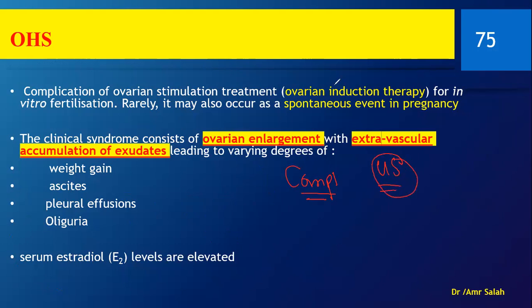that will make us suggest this ovarian hyperstimulation syndrome would be the patient having moderate ascites, because the mild ascites might not be assessed well by the ultrasound. So her having ascites, that's to say we would take a look at her abdomen and we'd see fluid between the liver and the kidney. Okay, and pleural effusion. So this would place her into even a severe degree of ovarian hyperstimulation syndrome.